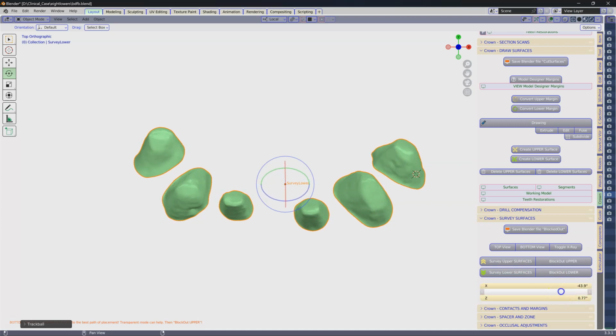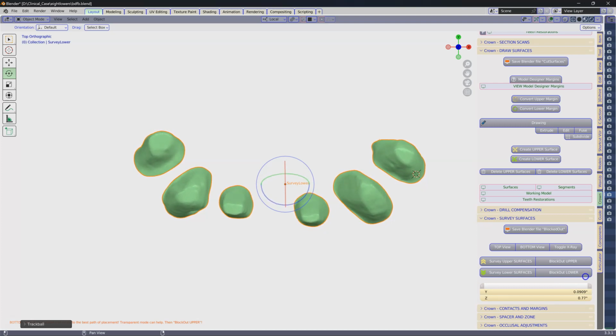Now this is just a temporary, which means we're going to have problems here in the back. If I look at this in transparent mode, you'll see all of this is undercut here and there. That means the end result will have an opening, but because this is a temporary, we're going to leave it like that. Else we would have to maybe cut the tooth prep, or do them single and then have this only as a bridge. So we would need to look at alternative strategies.